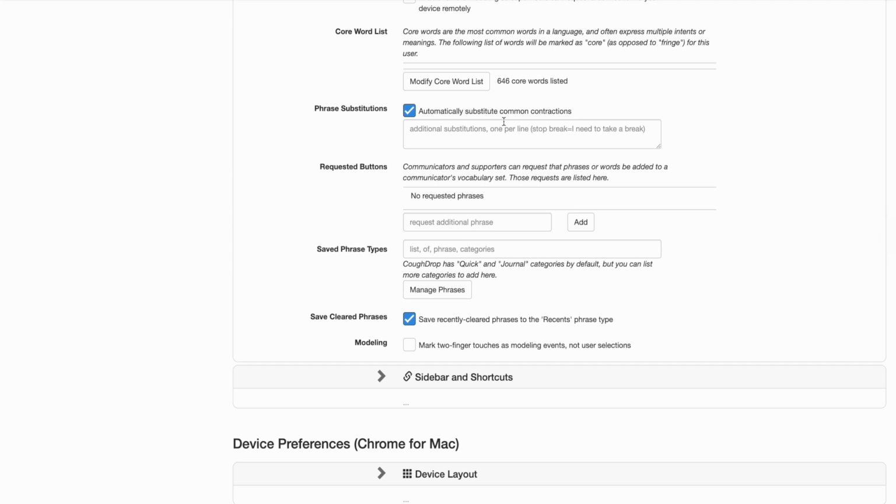And you can also make it somewhere in here, I'm sure we'll find it, where you can put in 2-word phrases, and it'll go into a longer phrase. So you don't actually need to type out a full-on sentence. If there's something that you say quite often, you could just do 2 words and it'll turn it into that sentence. And I think that's a really cool option that you are able to do.